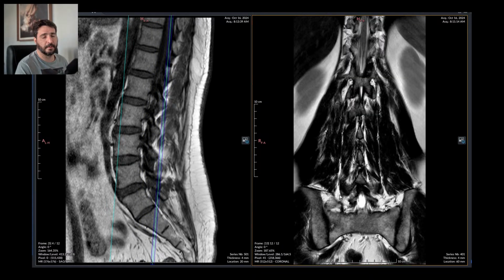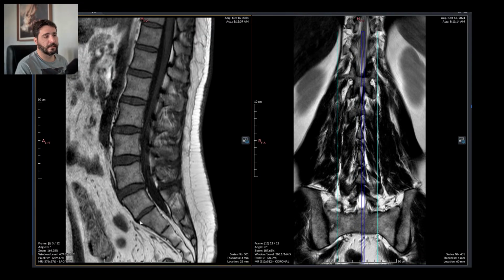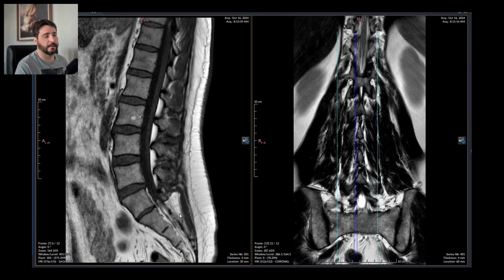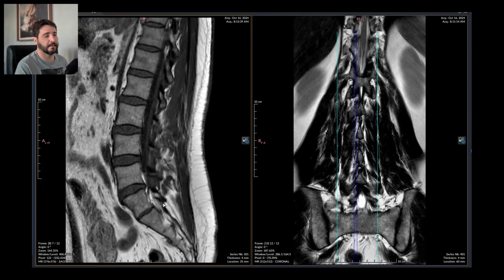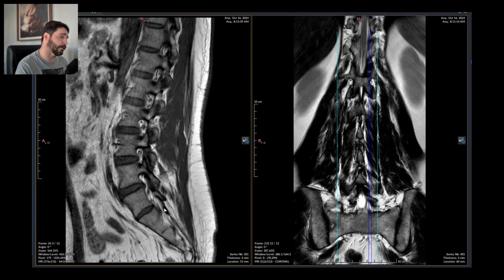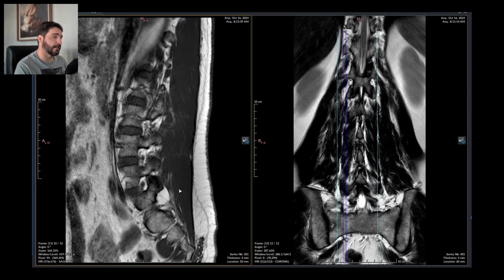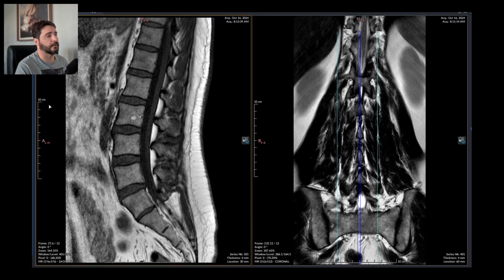There are some odd looking, awkward, hypoplastic joints between S1 and S2. And there is a rudimentary disc right there between both S1 and S2, which makes this a transitional vertebra. So the segment right above it is unstable and should be the first one to go bad.